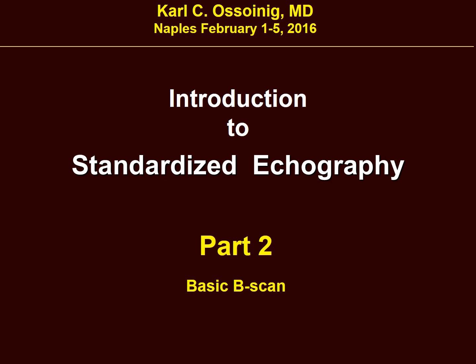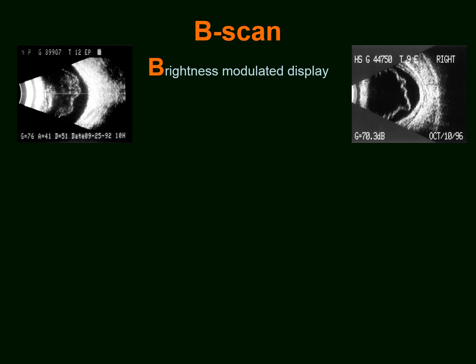In part 2 of the introduction to standardized echography, we will discuss some basics of the B-scan displays. The name B-scan comes from brightness modulated display. In B-scans, the echo signals are displayed as bright spots.